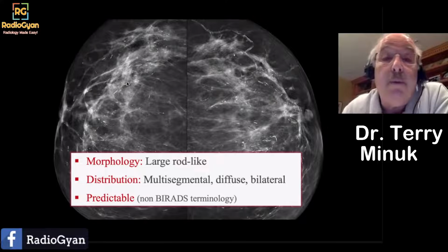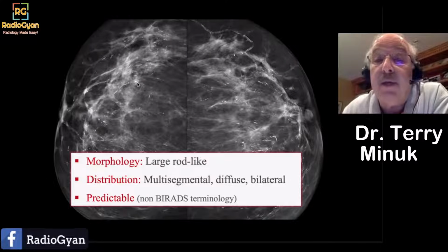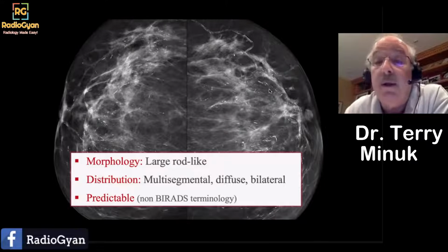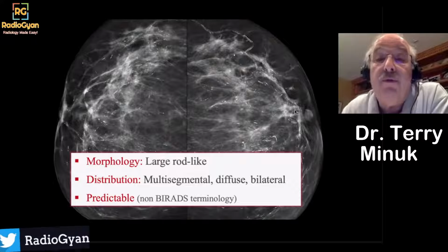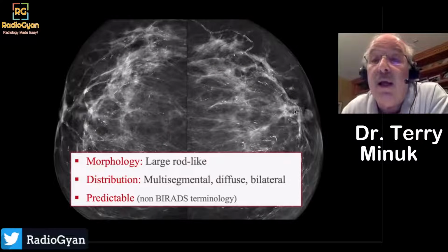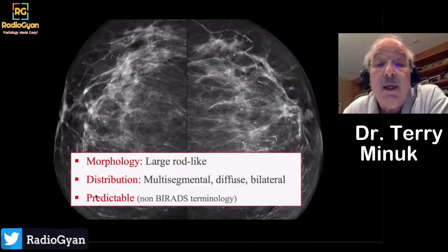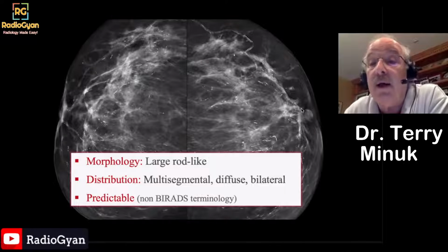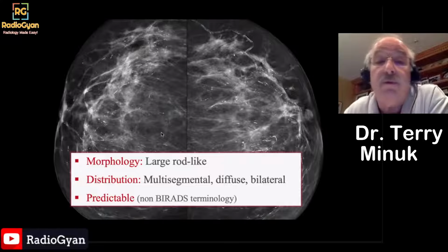And you don't want to be biopsying these calcifications. Yes, you will see the odd irregular calcification. It doesn't matter. This is secretory disease. It's calcification of benign secretions. These people are asymptomatic. It's predictable, these calcifications, because they occur in pre-existing ducts. And so when you look at it, you could almost draw the duct system of the breast.